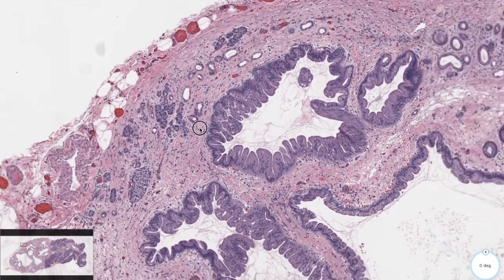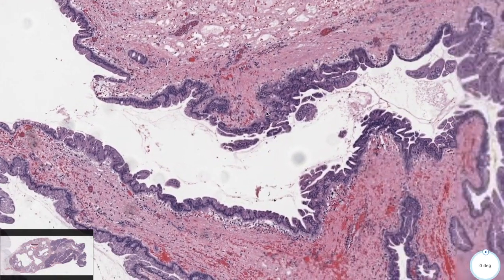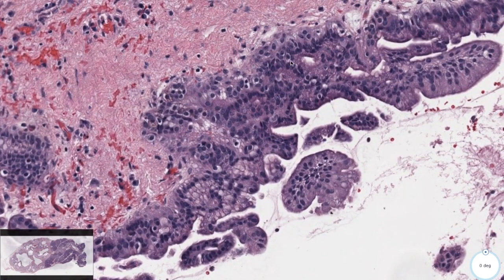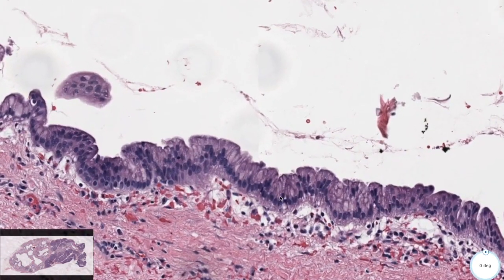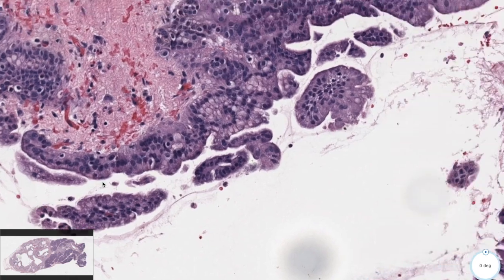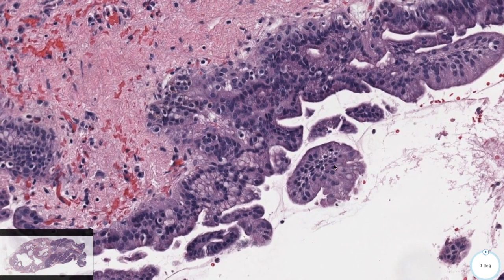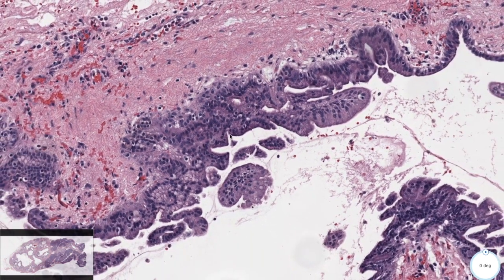You also want to look very carefully through these lesions, and you want to look for two things. You want to look for any dysplasia. Stuff like this is very worrying. Maybe this is a nice example. Right here, this is kind of like low-grade dysplasia because the cells are tall, they're columnar. But then over here, we're seeing maybe not so much high-grade dysplasia because the nuclei are not getting cleared. They're not growing so much on top of each other, but it is more worrying to me because these nuclei are kind of stacking on top of each other a little bit.